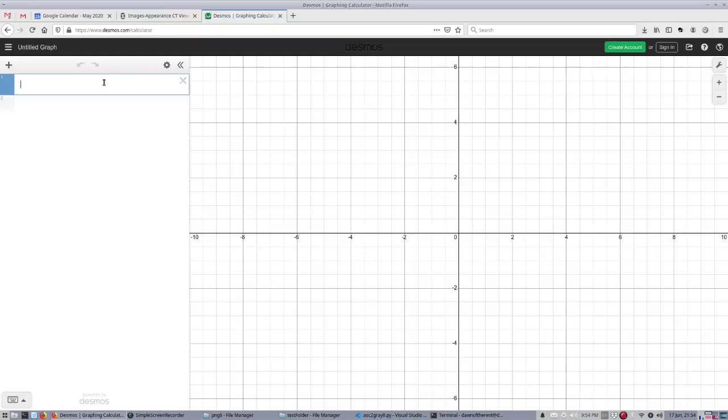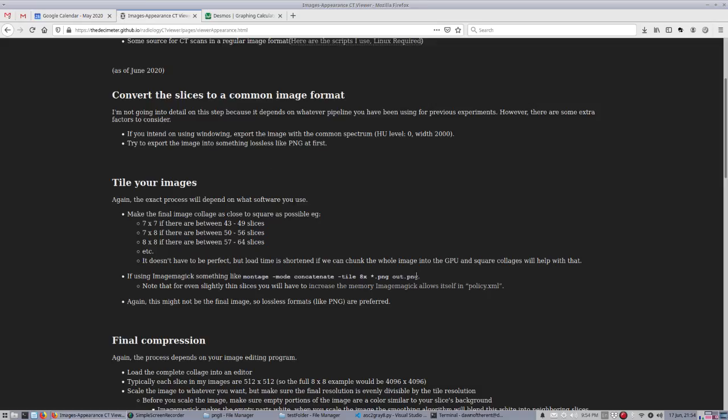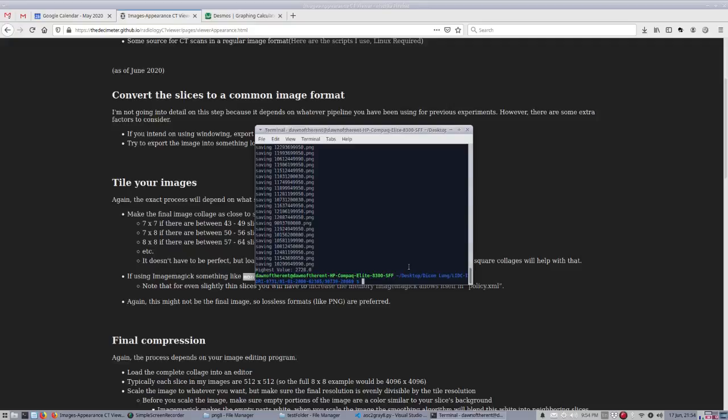So one image that's a grid of all of those slices together. Okay, so I'm going to open up a calculator and we'll see what that grid's dimensions need to be. So there were 420 images. So the square root of that is over 20, so we'll make one of the dimensions 20. So I'm going to use ImageMagick for this. You can use whatever program you want that can turn a bunch of images into a grid.